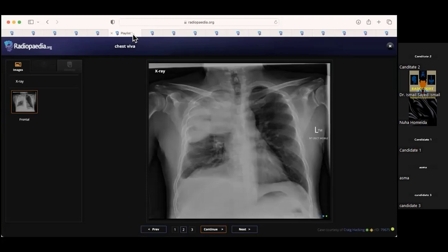And what type of pneumonia would you think of? Is there anything specific that you think of, given this appearance? I think of a Klebsiella pneumonia that may give this appearance, and this needs to be treated and followed up after treatment with a radiograph after 6 weeks to ensure appropriate resolution and no underlying pathology.